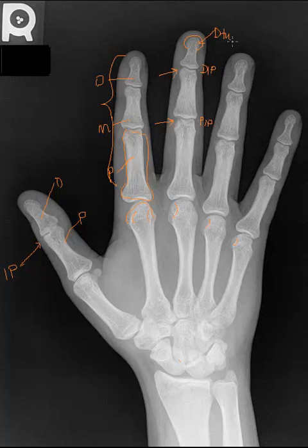distal tuft. Now, this region can become important in certain conditions that can cause resorption of the bone directly under the tips of the fingers. The differential diagnosis is quite long, and once we get into differential possibilities, we'll talk a little bit more about that. These are sesamoid bones, these little small bones that you can see both in the hands and feet. Again, sesamoids are within tendinous structures and typically are going to occur at the fulcrum of a joint.